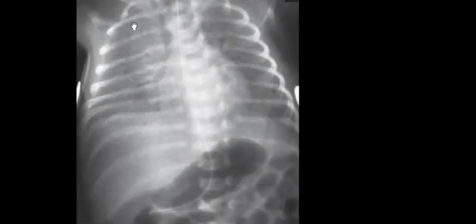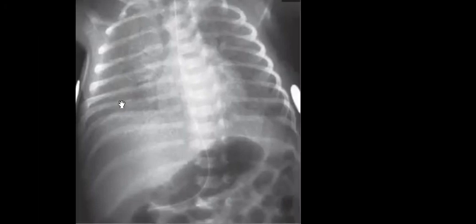So according to this question, you can resolve if you are talking about hyaline membrane disease or something else. So it looked like a small volume, probably, and the granular appearance affecting both lungs, more in the right side, with air bronchogram. You will check the history, and you know that hyaline membrane disease is the most common cause of respiratory distress in newborn. The good question about the volume, you want to check if this patient is premature or not. So if he is premature, you are talking about hyaline membrane disease. They like it in the MCQ as a common scenario in the exam.